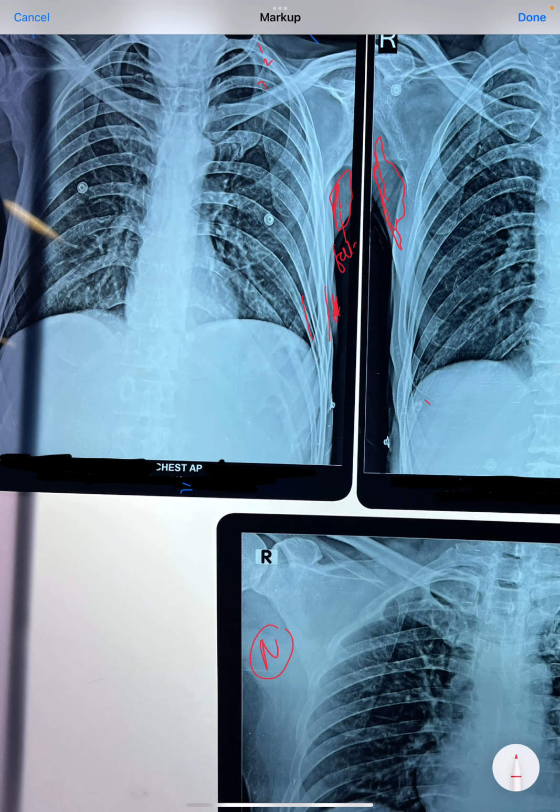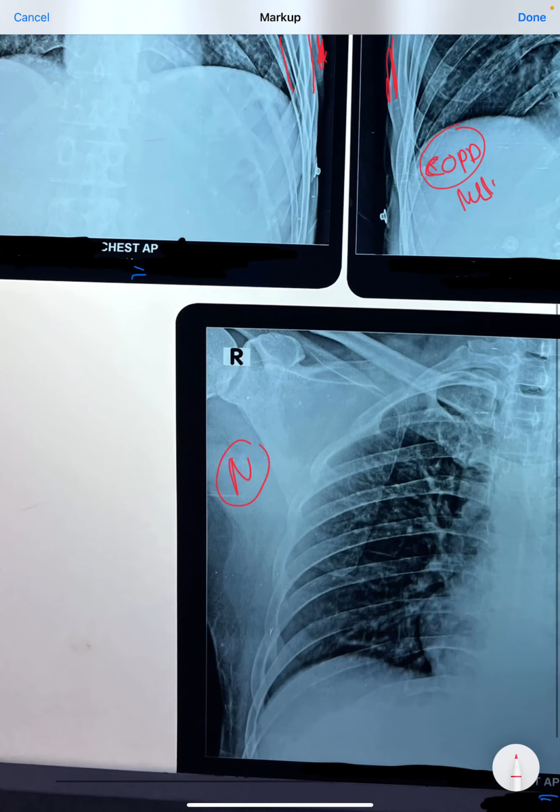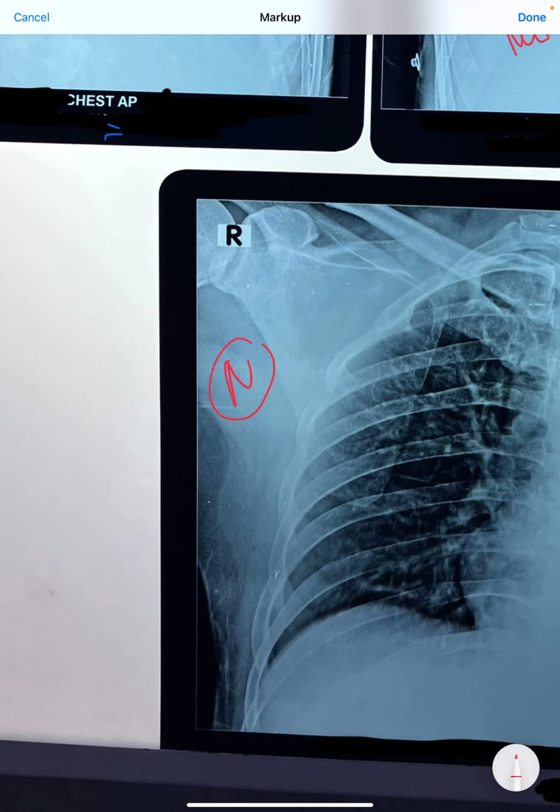Emphysema is a component of COPD, chronic obstructive pulmonary disease. There is chronic inflammation, which causes significant weight loss, significant fat loss over a period of time. That is the reason why these patients may lose complete fat. But whereas in this one, see, this is the rib margin, and we can see a very large area of fat.